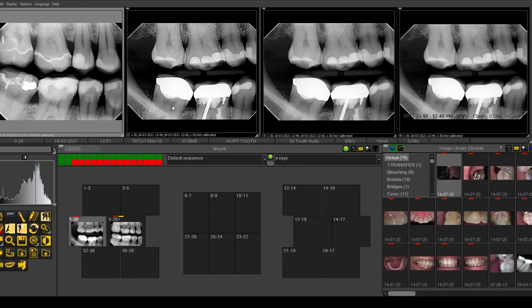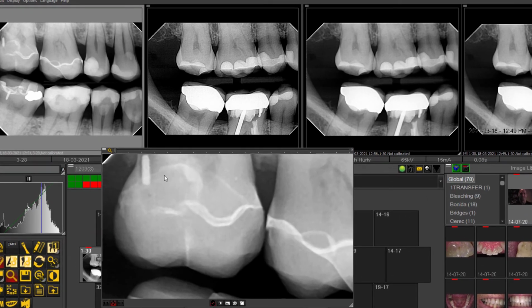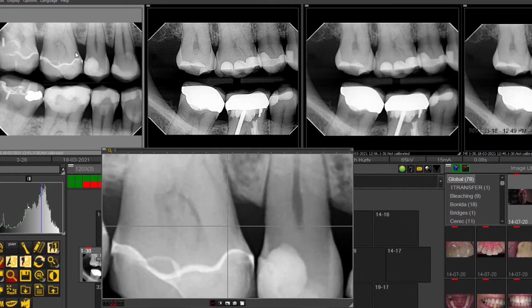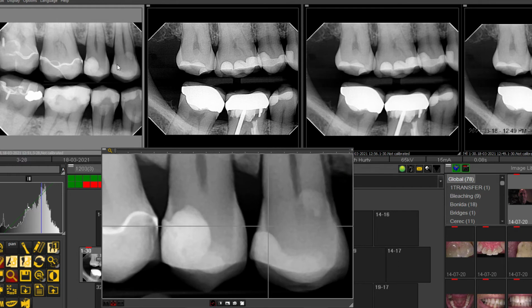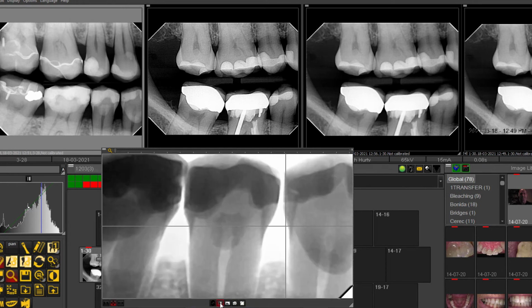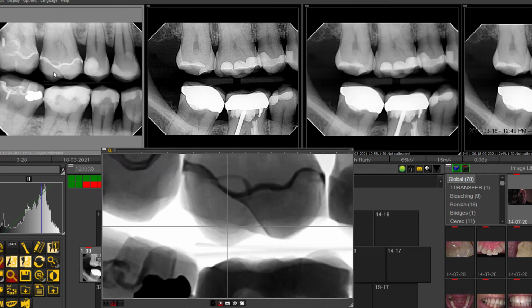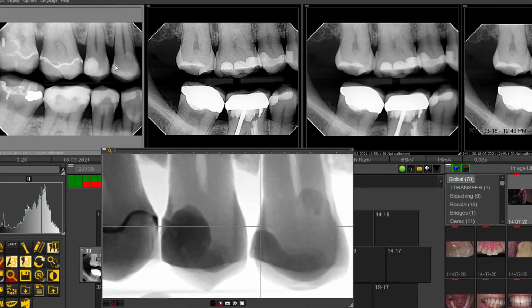But if you wanted to treat the image and have a magnified image and have a filter, the magnification icon, which is the big magnifying glass, will open up a window that allows you to move over the X-ray and look at different things, okay, once it's up there. But you have a choice of 4 filters below, which you can invert to a positive, and then as you move it over the screen, you can see the image in a positive format.